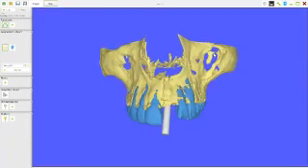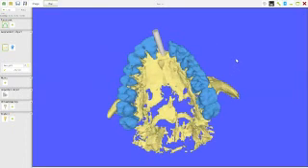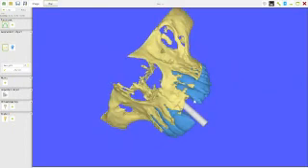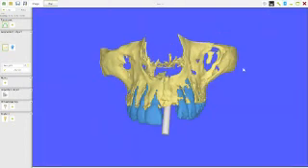Now, obviously, this is where the 3D model is good, because we get to see the relationship of the implant post, which is this thing here, in relation to the teeth. So from a restorative point of view, that's very useful, because obviously we don't want our posts coming out there. Now, you can switch on and off that extension by going to the tool, and you go to here and you can hide the extension, or you can bring it back in. So there's times when you don't want to see it, and again we'll talk about those times.